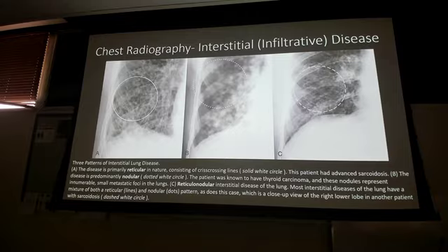Is this reticulonodular or is it just nodular? Does that make sense? I don't often give a whole lot of hints on the exam, but don't spend a lot of brain power over there. This is more, hey, you're going to see this in clinic. Not everything falls into bucket A or bucket B. Things can fall into bucket C, right? Focus on bucket A and B.